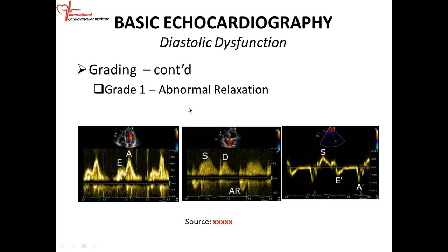And so remember, when the patient has diastolic dysfunction grade 1, it's a problem with relaxation. The heart is not relaxing properly to fill with blood. And this is what you actually get. So remember, your 2D is on top, and then you have the Doppler below. So this is a mitral inflow that we've been talking about. It's a diastolic period. So you have your E velocity, you have the A velocity, okay, and you do your deceleration time.